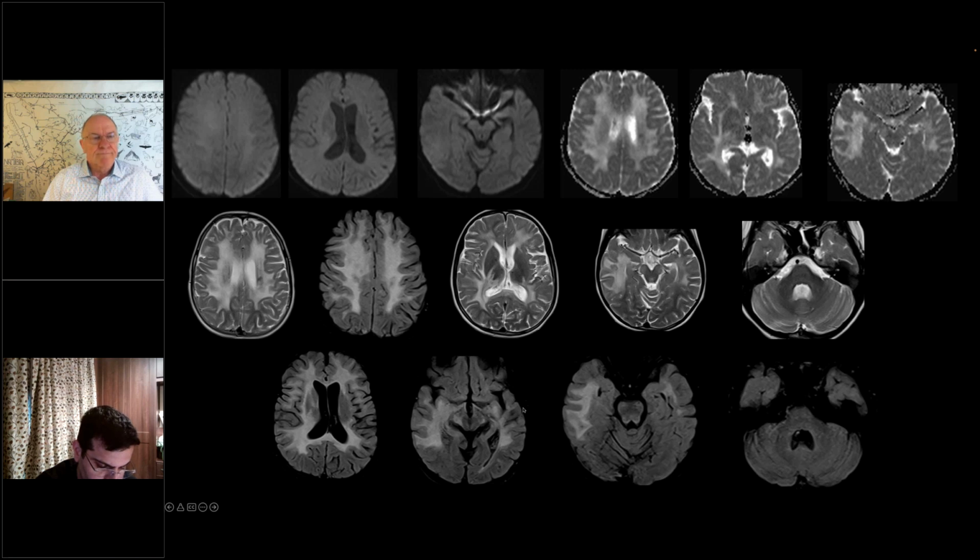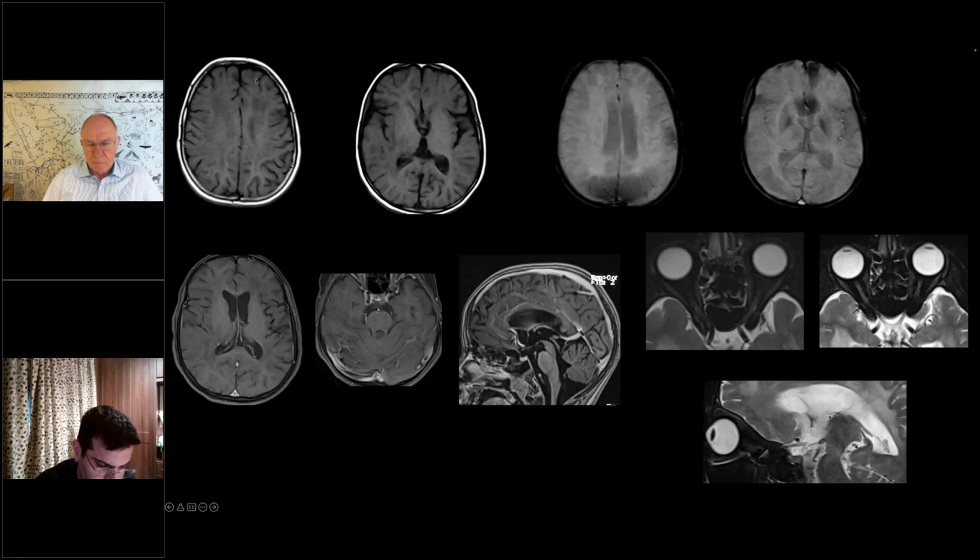Just a question to Romit. Sorry, I'll just finish up with the scan. T1 weighted sequences, no abnormalities per se, nothing on the SWI images. Contrast: I cannot appreciate any enhancement. The subcortical areas of slight difference on T1 correspond with a similar intensity on the post-contrast images, so I wouldn't attribute that to abnormal contrast enhancement. On fat-suppressed images, the optic nerves are slightly reduced in caliber. The right optic nerve is slightly hyperintense. Also, the distal segment of the left optic nerve is hyperintense. The optic chiasm also demonstrates these hyperintensities.